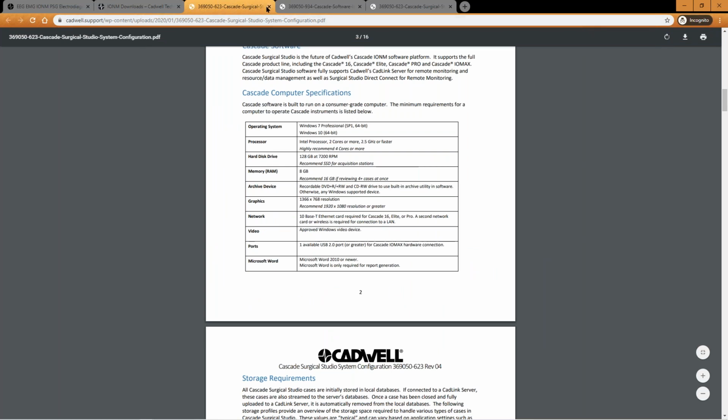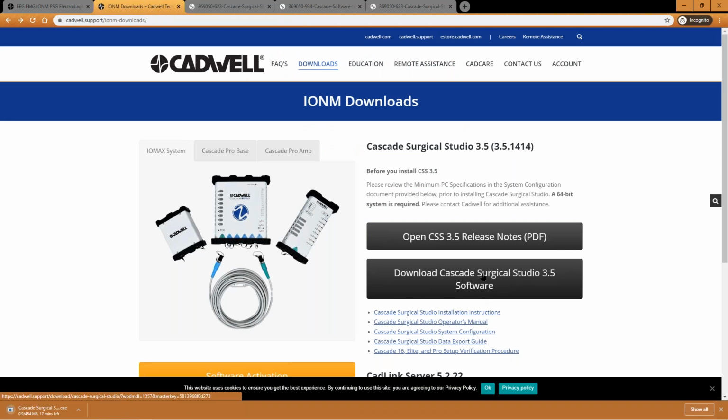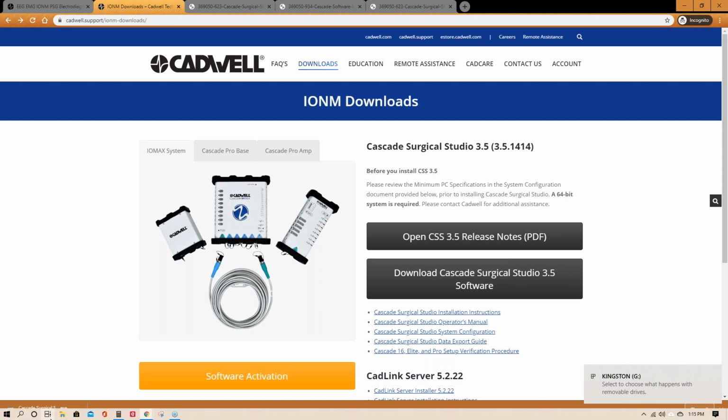So I then can choose to download it. Of course, you can download it before then. It's downloading now, but I'm going to stop that because I've already downloaded it. You would obviously let it continue. I have it on a thumb drive, which I'm going to put in my PC here and take you through the installation. So let me browse to my thumb drive.